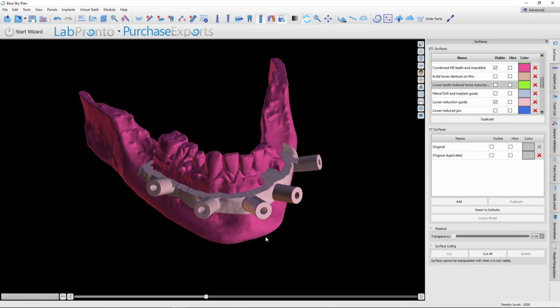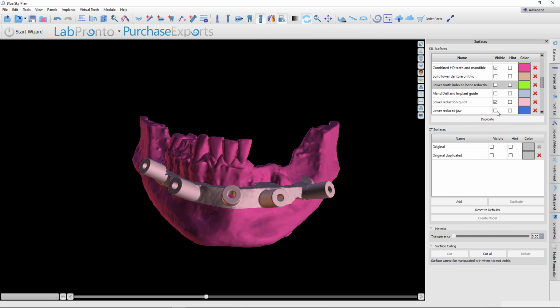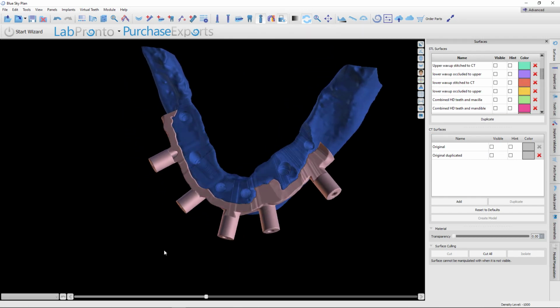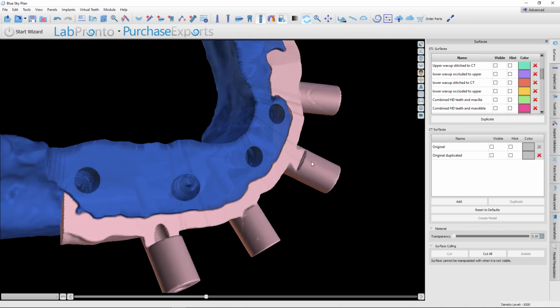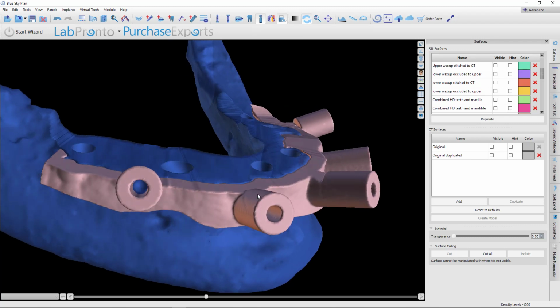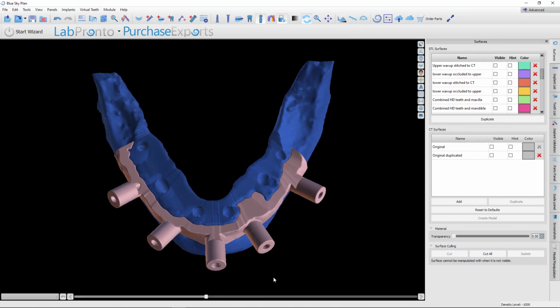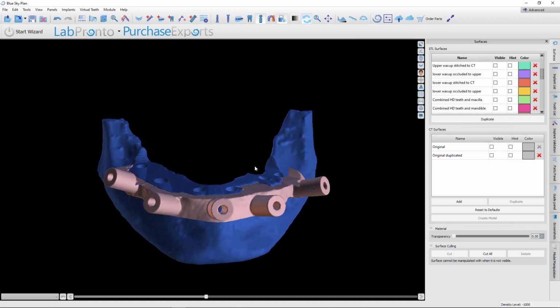This would be that reduction guide as a standalone, and once you've done the reduction, you would have this jaw. Okay, so this is your reduced jaw. Once again, the implant holes are already present in case you want to do a mock surgery, including the pins. The pins will go into place, as you can see right there through the transparency. So we do our bone reduction all the way down to this flat spot on the reduction guide, and then we're ready to take this out, trash it, and now put in your drill guide.